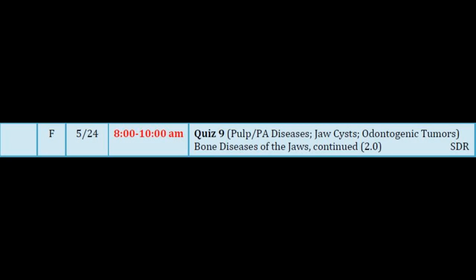When the patient went back with more pain, and it was still there, and they finally biopsied it and figured out what it was. Even from the beginning, there was an area of increased density as well as the lucency around it. Breast and prostate stimulate an osteoblastic response in the host bone. It makes the host bone fight back. So we can get weird mixed changes, part lucent, part mixed. So those are weird. They just do that.